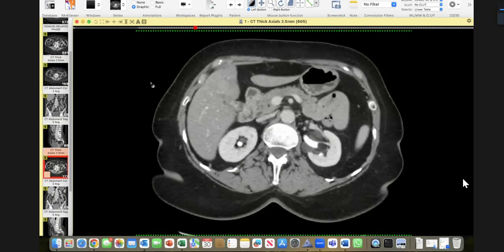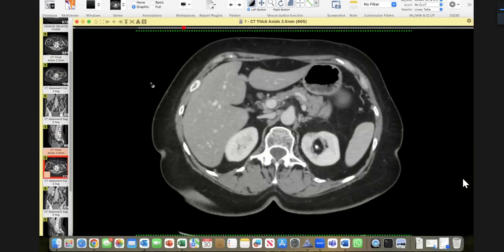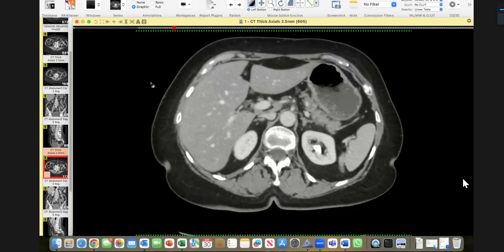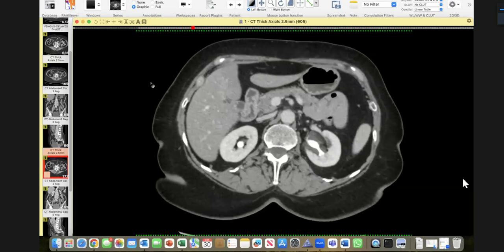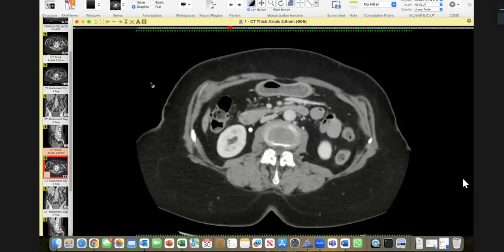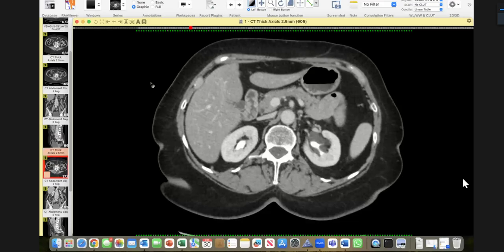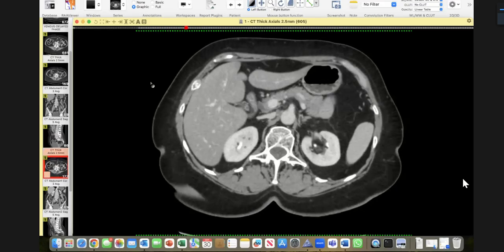So now I'm examining the delayed phase of the post-contrast multiphasic kidney scan. Both kidneys, actually, these proved to be not intracalyceal. Because the contrast is going through the pelvicalyceal system, and these are parapelvic lesions that are not enhancing.